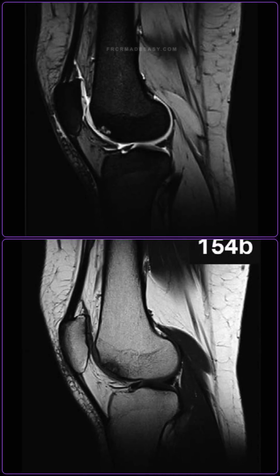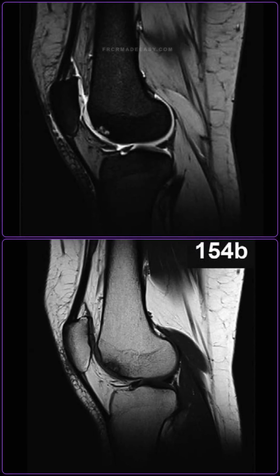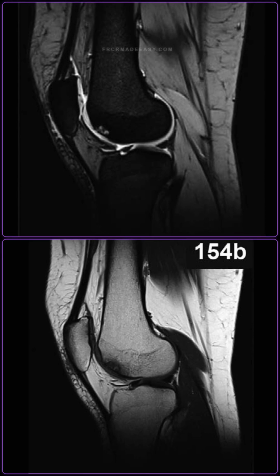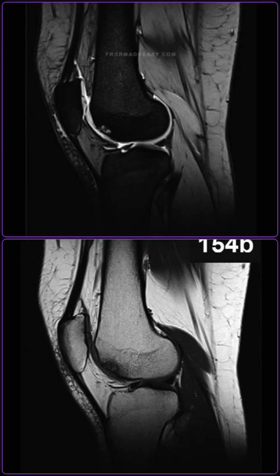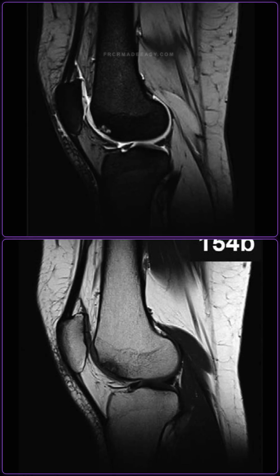Marked bone marrow edema is present in the adjacent subchondral bone of the lateral femoral condyle, indicating acute trauma. The presence of a high signal T2 fluid rim surrounding the fragment is a critical indicator of fragment instability and potential detachment into the joint space as a loose body. Discuss the pathophysiology of osteochondritis dissecans and how magnetic resonance imaging evaluates its stability.